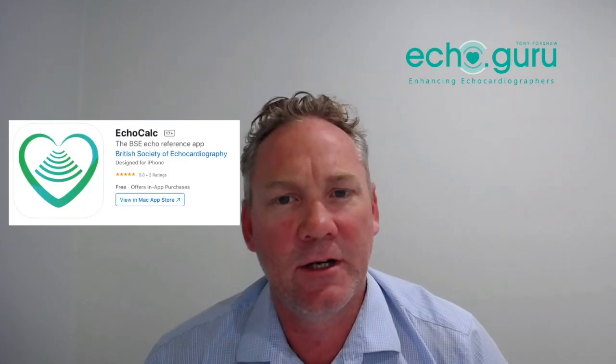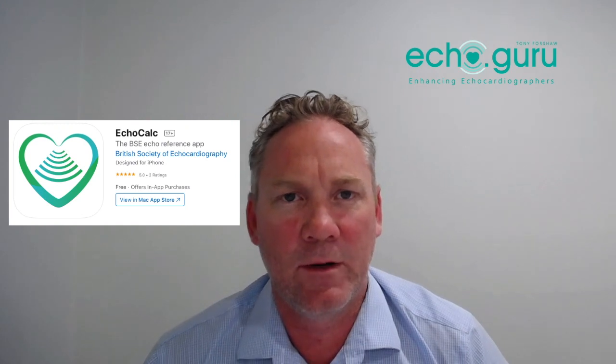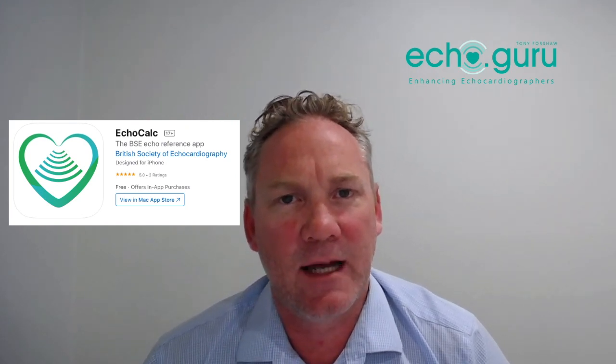Today we're going to have a look through the EchoCalc app, which is available for both iPhones and Android devices. This application is a new updated version, and it's been released by the British Society of Echocardiography along with Dr. Alan Arkness. It's a fantastic application.